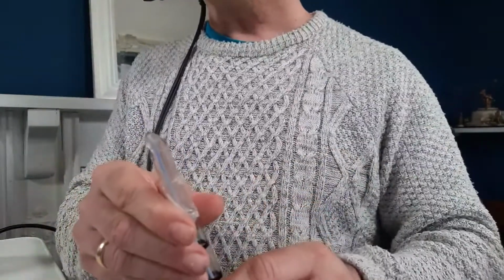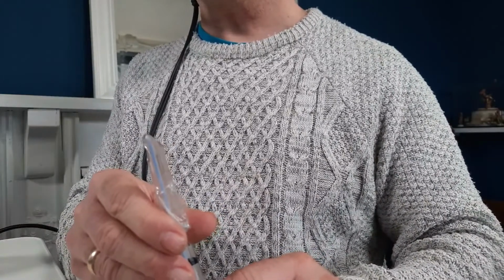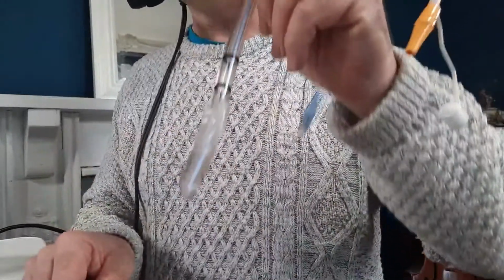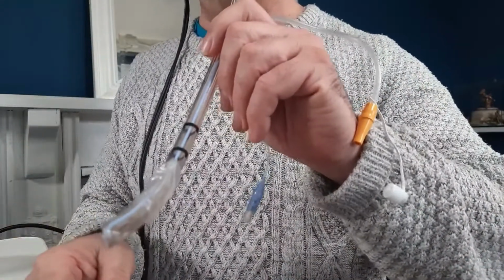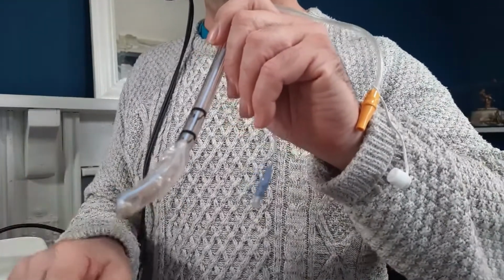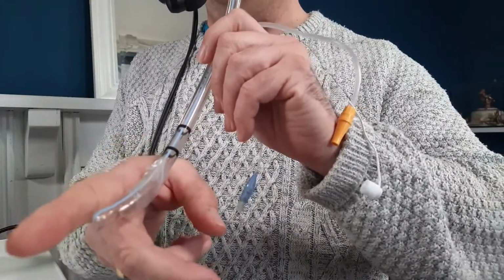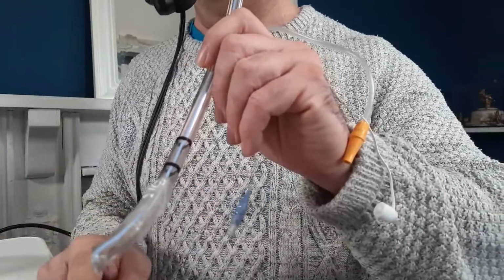And you'll also notice that the end of the tube is actually beveled. It's not flat. The main reason it's beveled like that is that when the person is putting the tube down the patient's airway, if it was completely flat, it would almost obstruct the view of the cords. So cutting it off at an angle like that means you can see the cords a little bit better. So that's the purpose of that. It also makes it less likely to sit against the wall of the airway and block the tube.